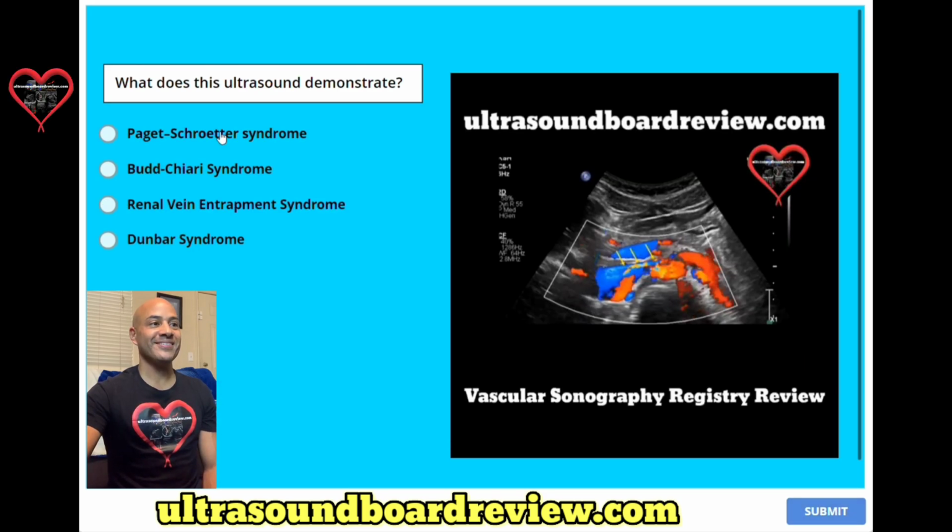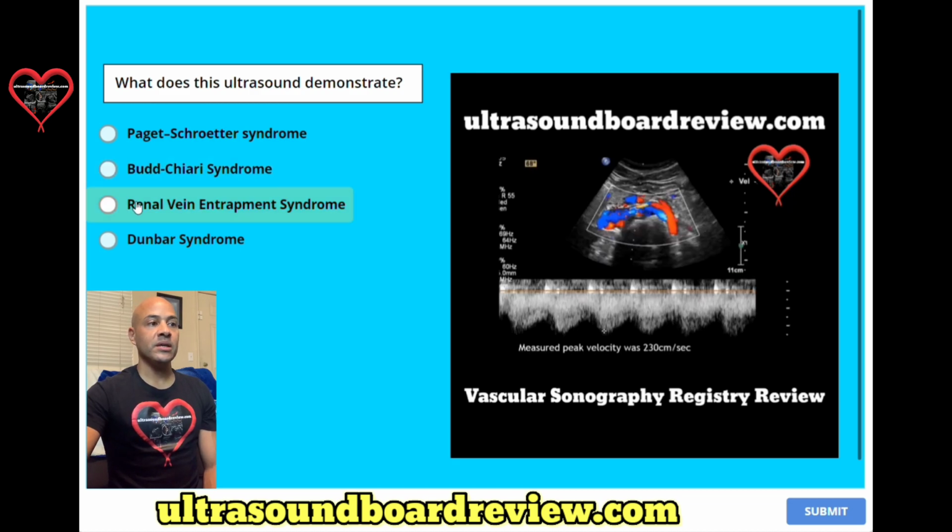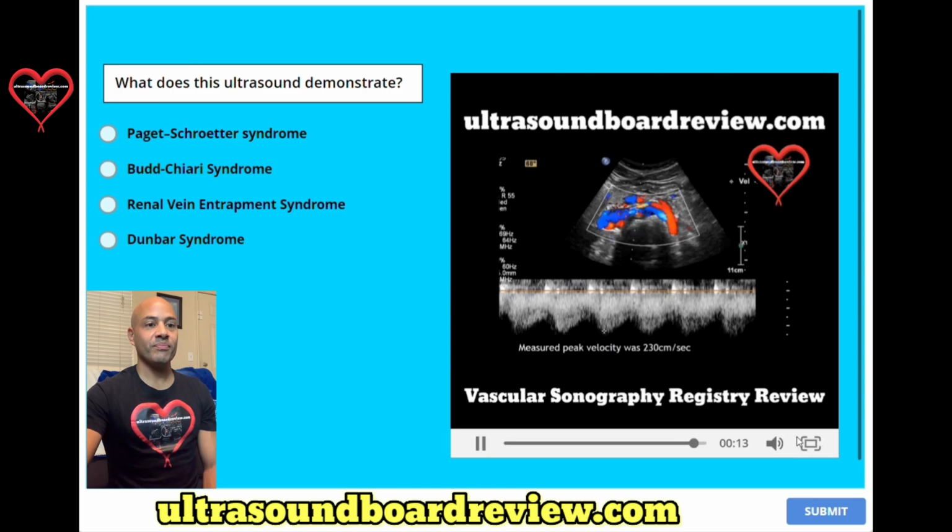Question 83. What does this ultrasound demonstrate? A, Paget-Schroetter syndrome. B, Budd-Chiari syndrome. C, renal vein entrapment syndrome. Or D, Dunbar syndrome.